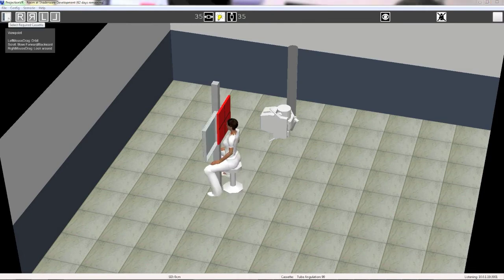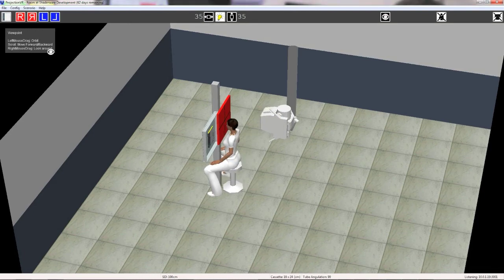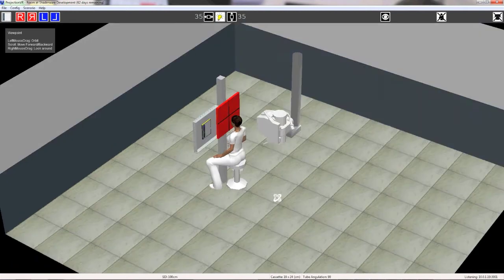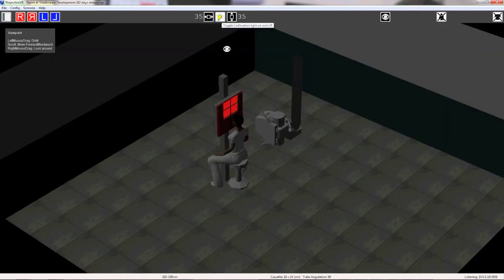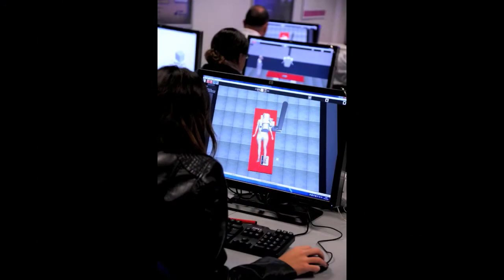It is highly interactive and intuitive, with a point-and-click interface enabling the student or tutor to get right on with the learning. Multiple computers allow multiple X-ray rooms, and laptops allow portable X-ray rooms. In these pictures, 18 students at one of our customer sites are in the middle of a class wholly built around the use of Projection VR.